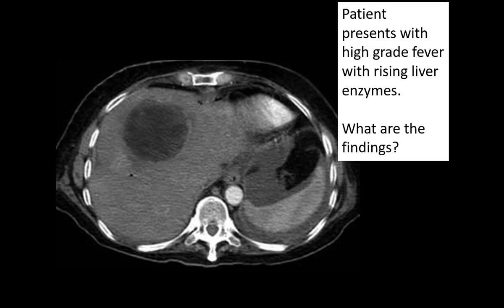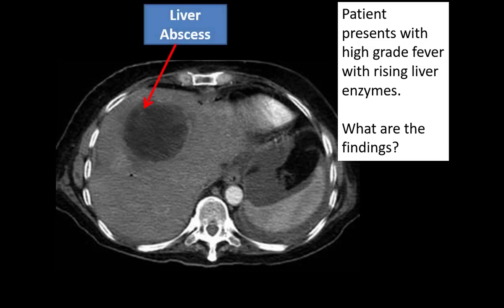A patient presents with high-grade fever with rising liver enzymes. What are the findings? Abscess. There is a liver abscess.